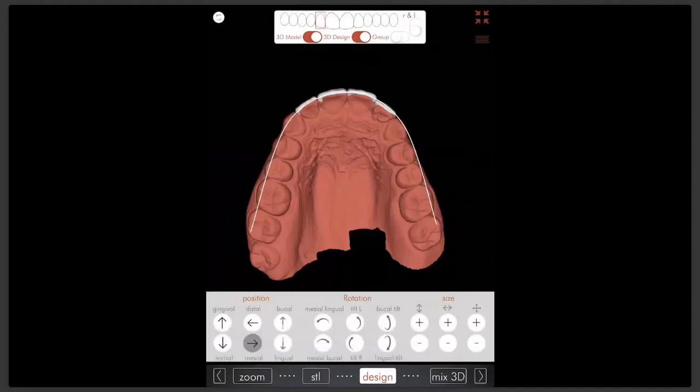Okay. So we need to play with these controls to really understand what each one does, so you know what you need to move. The first time you do it, it seems very complicated. It's going to take much longer, but once you get used to it, I promise it's going to become easier.